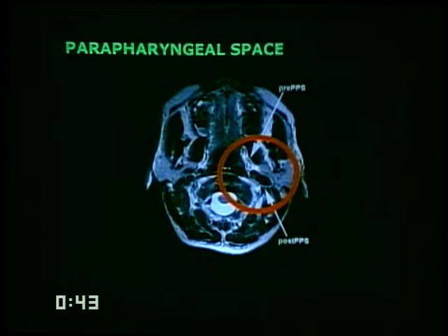So you get a neck CT or a neck MR, the first thing you want to look at is the airway. Is the airway patent? If it is, look at the post-styloid parapharyngeal space on both sides. If the post-styloid parapharyngeal space on both sides is normal and the airway is patent throughout the field of view, you have ruled out 90% of significant pathology in adults, the most important space when looking at images of the neck.